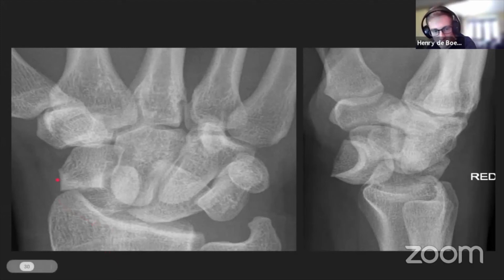Okay, looking at this film, these carpal bones on the AP are not at all normal. This is all over the place, this row, and this middle row, I don't even know where that's gone. The lunate here is a very funny shape, it's pie-shaped.